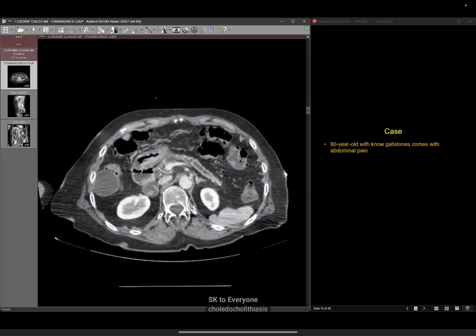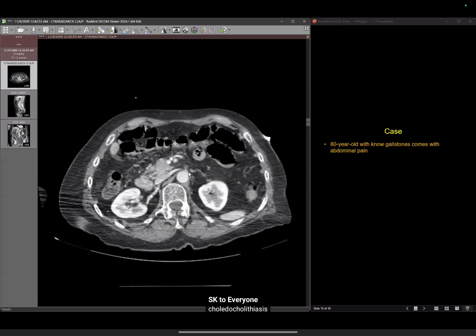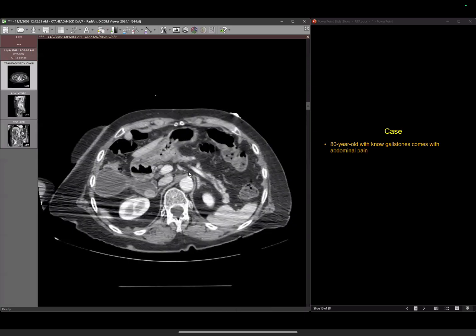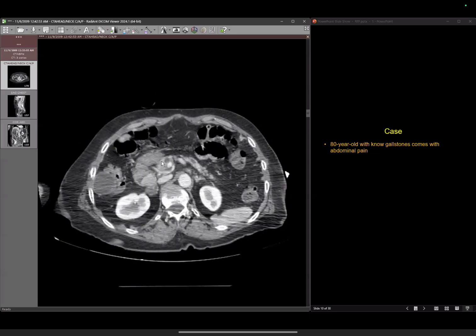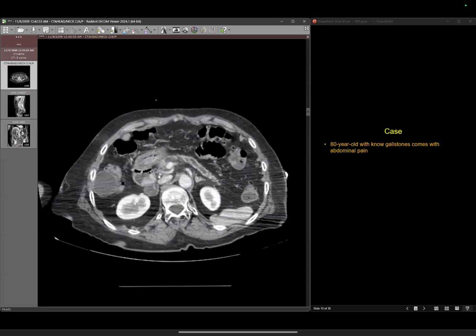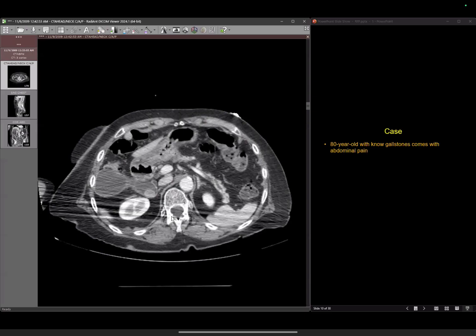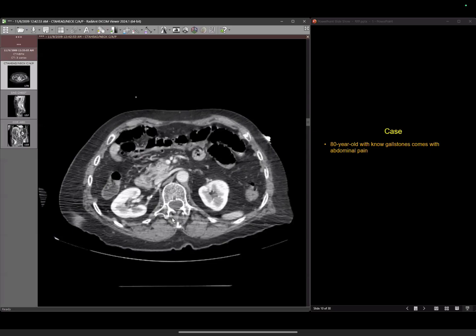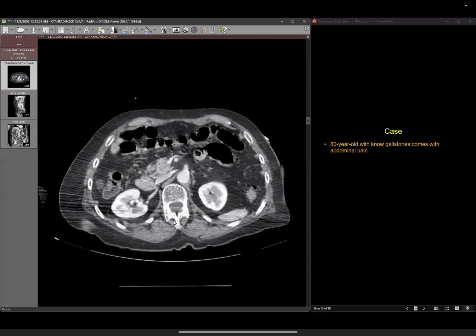So other would be the cystic neoplasms of the pancreas that may be associated. So with isolated cystic neoplasm, well, if it is a main duct IPMN, you should see duct dilatation all the way to the ampulla, right? Do you see that? No, sir. So when you use the right word, you have to use the correct term. You said there is abrupt termination of the pancreatic duct. When somebody picks up the phone and calls you and tells you, I see an abrupt termination of the pancreatic duct, what is the thing that you worry about the most?